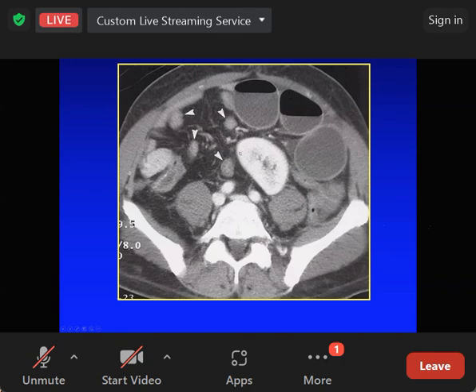And this is just a pelvic kidney, which is enhancing much more than some of the other structures, because if you remember, at rest the kidneys have, I can't remember, is it a quarter of the total cardiac output? They're very vascular organs, as we all know.